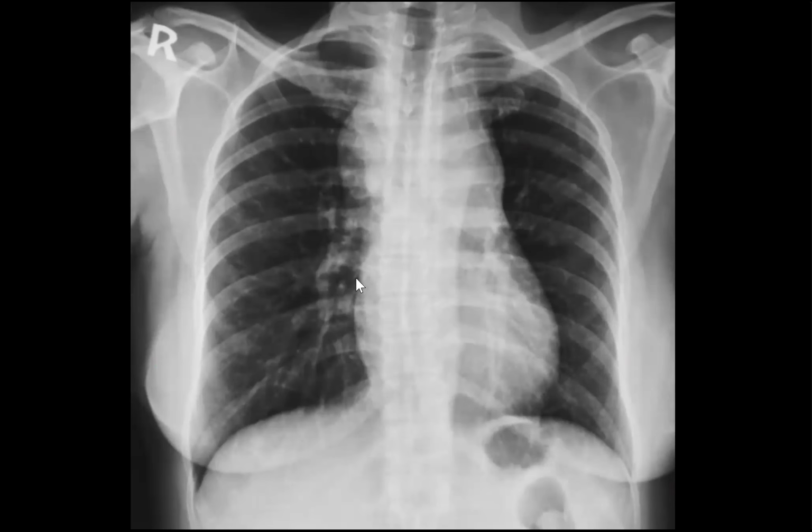Why did you say it is anterior mediastinal? Give me three reasons why you diagnose it as anterior mediastinal. Sir, it is causing superior mediastinal and anterior mediastinal widening. And again, sir, I can see the hilar vessels, the hilum overlay sign. Number four, the cervicothoracic sign is positive. Yes, very good. It is not crossing the clavicles, and it fades out above the clavicle.